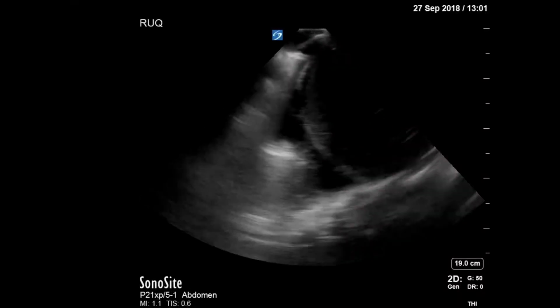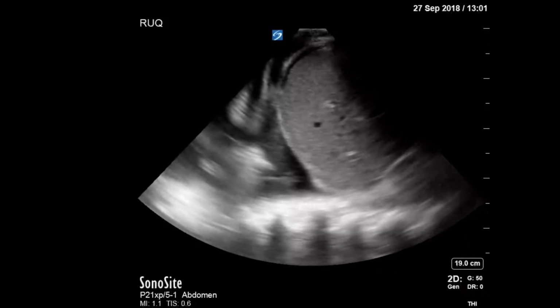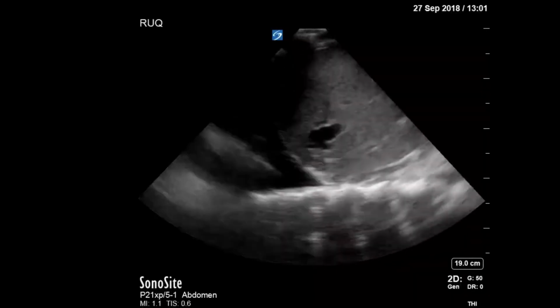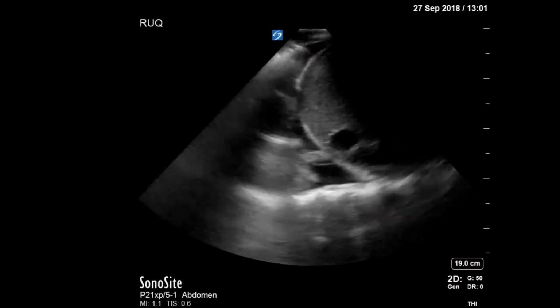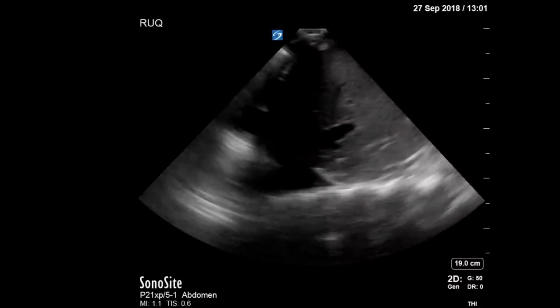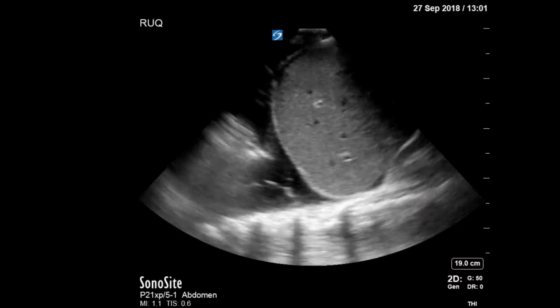In this clip, at the top section of the clip, there is a small amount of ascites that separates the liver from the diaphragm. In this instance, you can see that the actual liver capsule is not as thick or bright as the diaphragm. It might be a clue to realize that you're not looking at the actual diaphragm if it is obscured for any other reason.